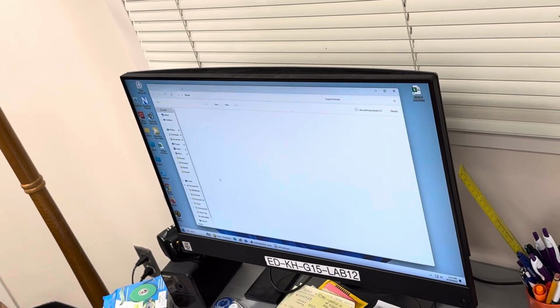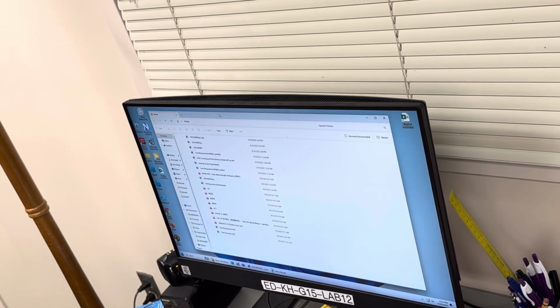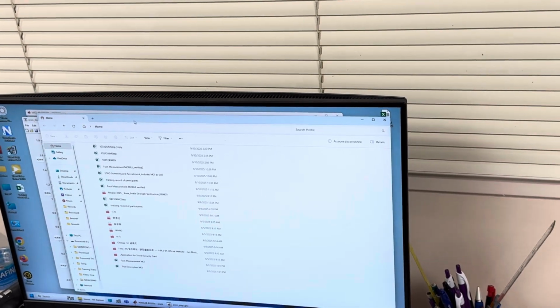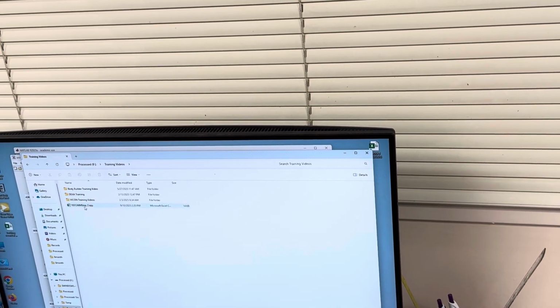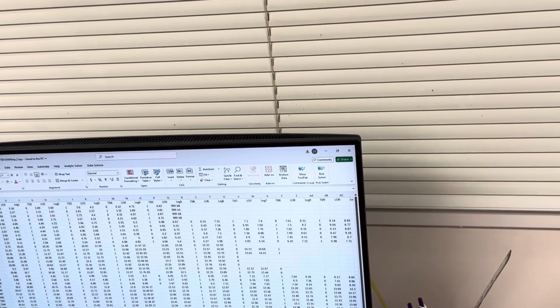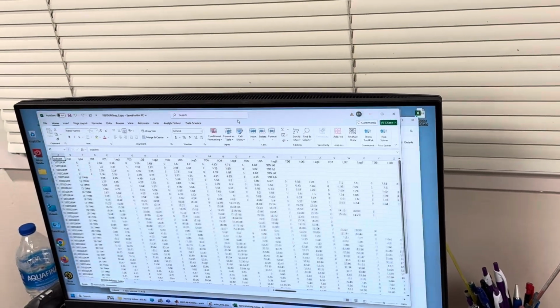Right, treadmill is easy. I mean, everyone has their own opinion. I think the treadmill is much easier. Or the overground is easier for step time, I think, because it's only like 5 steps. It depends on the person, though. All right, let me just find it. I made a copy so I don't screw up anything. Oh, I was talking before about asking for the Vicon. Never mind. Step time is very easy for overground Vicon. She does more Vicon right now.